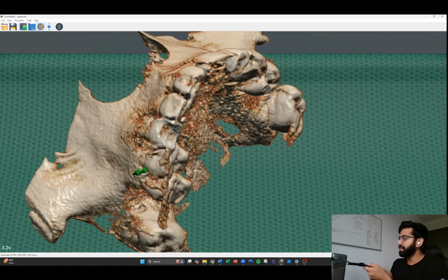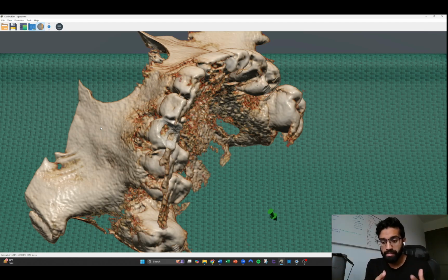Remember, we're trying to enable medical professionals to interact with their patients' imaging in much more clinically effective, clinically meaningful ways that allow them to deliver their best possible care to their patients. And by showing them what a surgery would look like, not just in 3D, but over time in 4D, and with a touch sensation in 5D, essentially, we can give them a much deeper understanding of their patient's anatomy and the surgery and the procedure they're about to perform than they could previously.